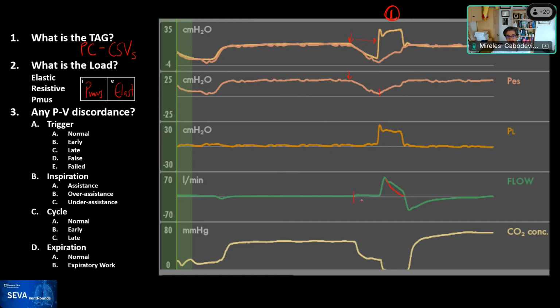You can see the flow going up above baseline. The scale is not very useful here, and this will happen, which you cannot necessarily see. But if I had been a nice person, I would have grabbed this cursor and I would have dragged it.